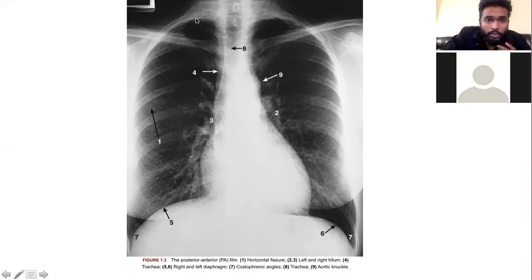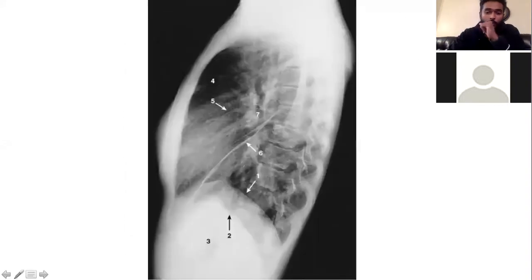It's hard to see, like 1, 2, 3, 4, 5, 6. So the sixth rib curves around here. So somewhere here. If there's a line from here to here, that's gonna be the horizontal fissure, always on the right side, and there's no horizontal fissure on the left side. Give me one second. All right, and then on a lateral view, where do the fissures run, Kenny?